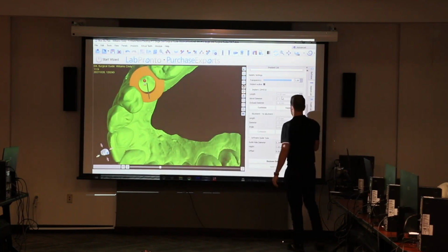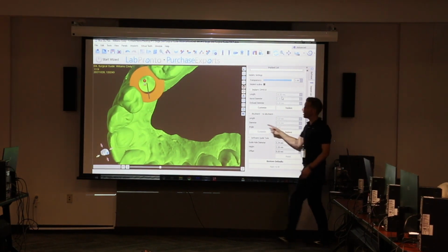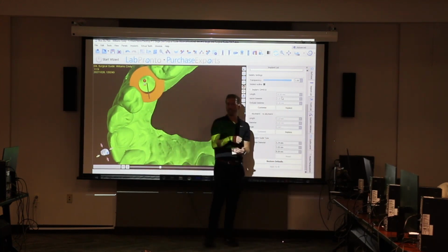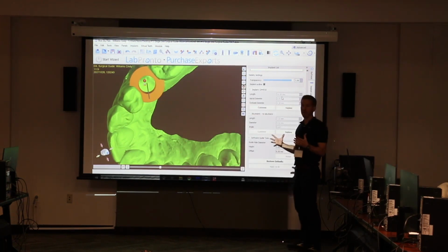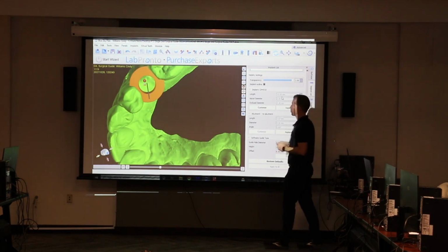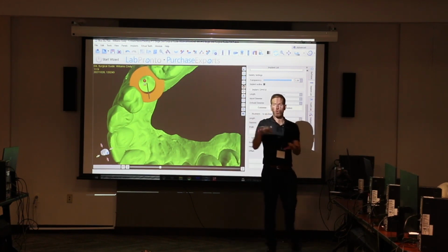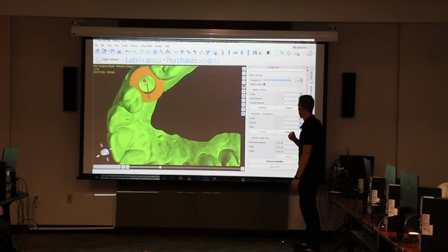So the default that shows up is 5.34. On everybody's Blue Sky, it's going to show up. The default is 5.34 from here to here. That's thinking that we're putting a metal sleeve in it, because that's the default, and that's thinking that the printer is calibrated to be accurate at 5.34. The height, again, this is where we can change the height of that guide tube. Remember, we can make it taller, shorter for more engagement only if we're going sleeveless. If you're putting a metal sleeve in there, all you get is the 3 millimeters of metal.